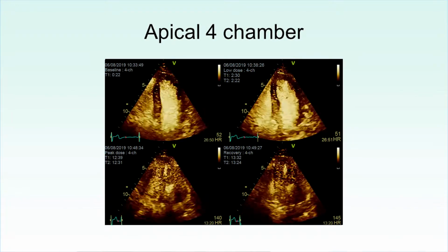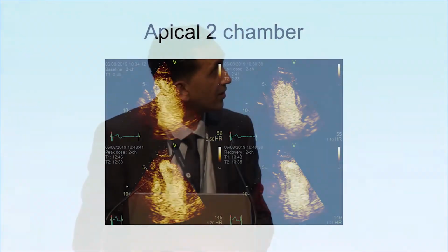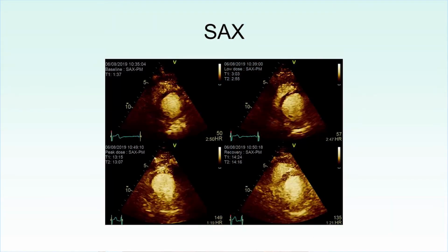So if you look very carefully, again, a normal response there, normal response there. Let's go on to the inferior one, slightly down there, suggesting there was some impairment. Again, normal response there, maybe slight improvement there. Certainly inferior territory is a lot better. And it continues to improve. So infralateral territory is pretty good as well there.